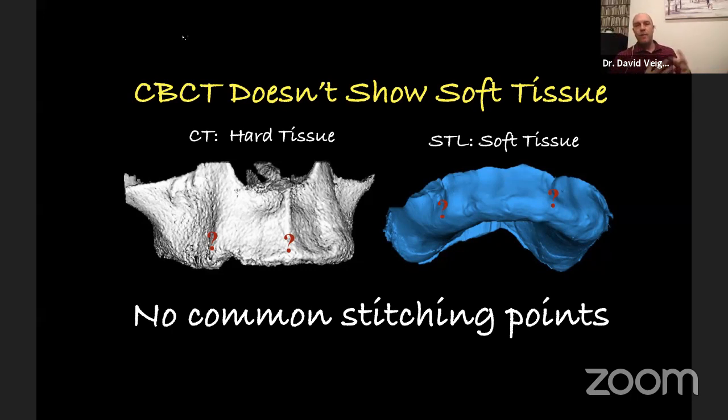One of the most common ways of linking the two together is to use radiographic markers, but not radiographic markers in the traditional sense where you use them on the front surfaces of teeth to tell you where that prosthetic envelope is, but rather radiographic markers that are very specific so the two data sets can be linked together in the software.